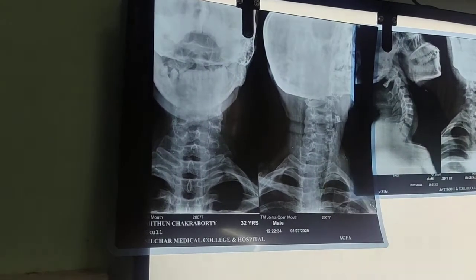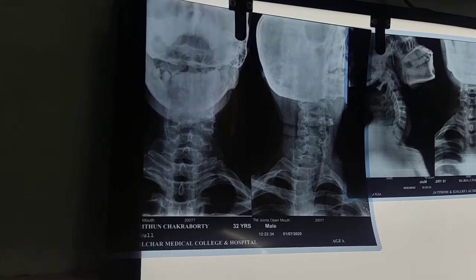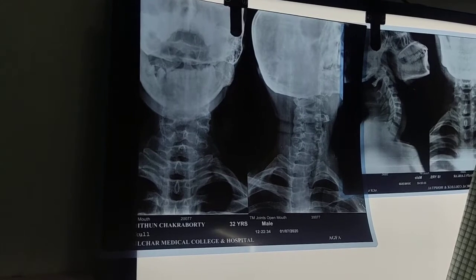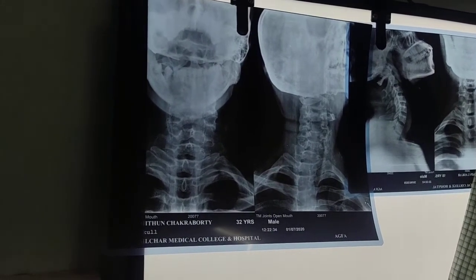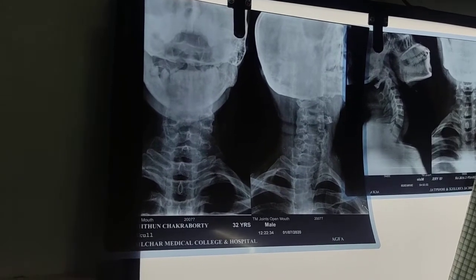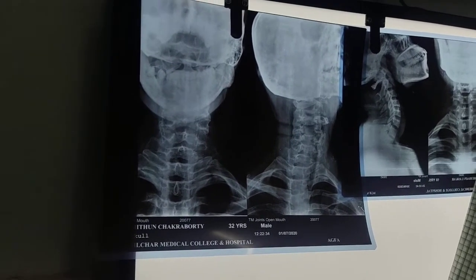This should be clear. So up to now, do you have anything to ask? Particularly this part is a bit important, and the ratios are very important to understand the craniocervical junction. The craniocervical junction is very vital, and in trauma in this area, since you have the vital centers of respiration and other things there, if there is instability and a displacement there, it will probably be catastrophic to the patient.